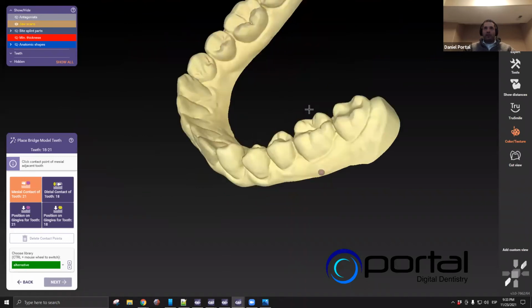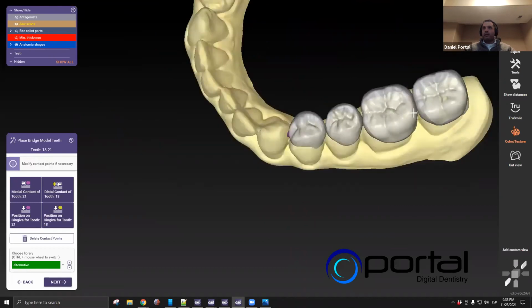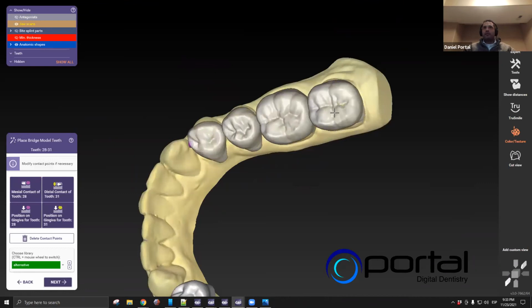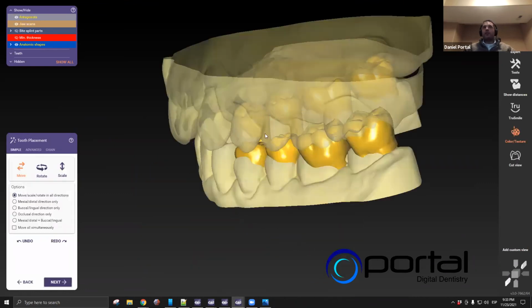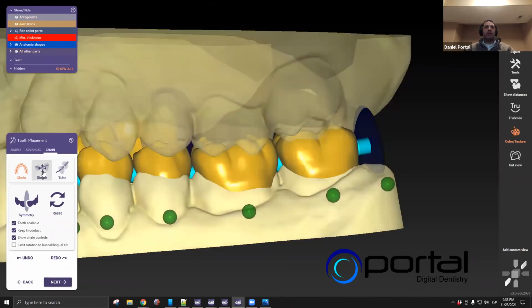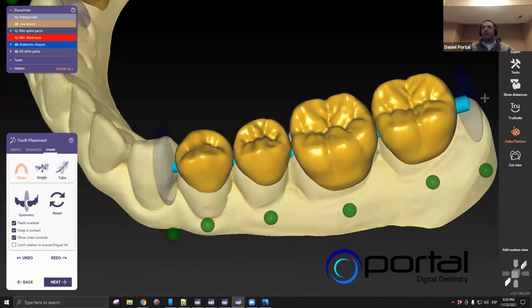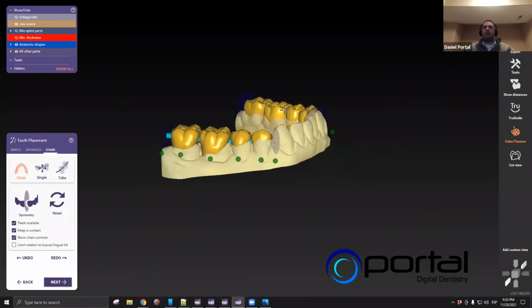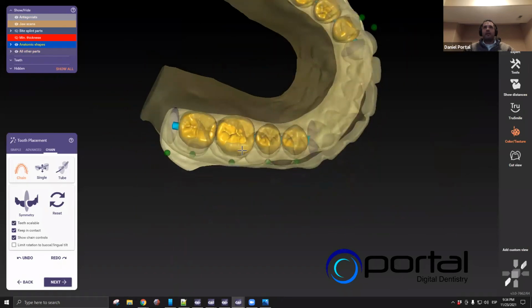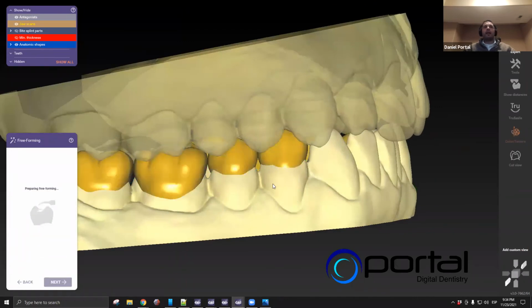So the way it would work is, as you go through the design process, the software will allow you to place some anatomies. Okay, and then it'll take you through the same exact steps we just went through a second ago to position these a little bit better, giving you access to the same exact tools. And so in the interest of time, we'll just say that this positioning here is perfect for that side. And then the same thing here. All right, and then we can move on to the next step.